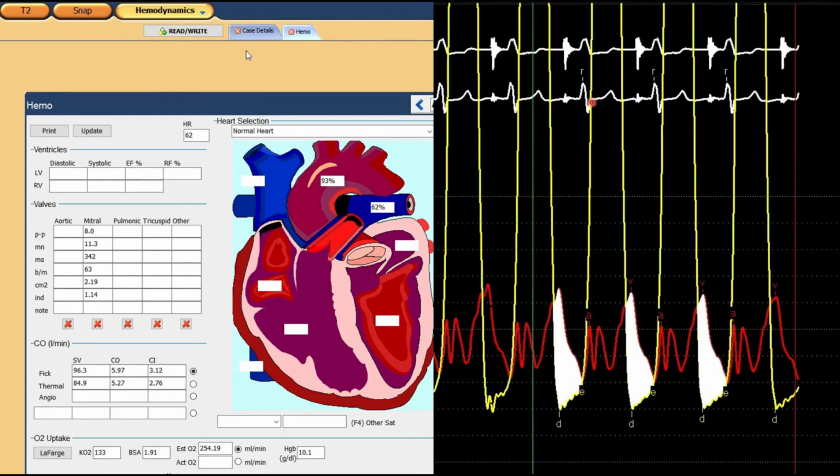And you could see, since he's paced and has a heart rate of around 60, you could estimate that this is somewhere around a third of that, 300 milliseconds or so in duration. That's over here what the MS is. That's the diastolic filling period. So you know the rate at which all the stroke volume fills the ventricle during diastole.